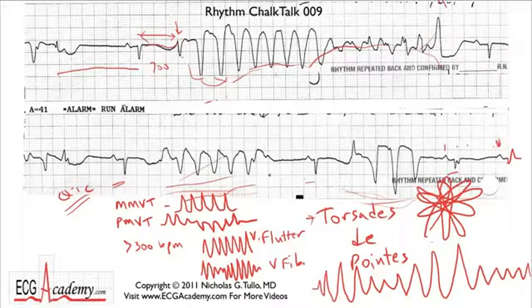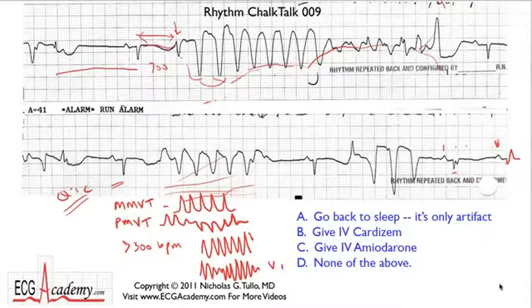That's what I'm trying to do, to get you guys to understand that not every ECG looks the same. They don't all look like the textbooks, and that's why you need to watch these Chalk Talks and go on to ECG Academy. So let's figure out what the answer to the question is.